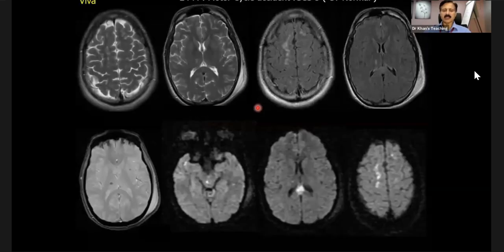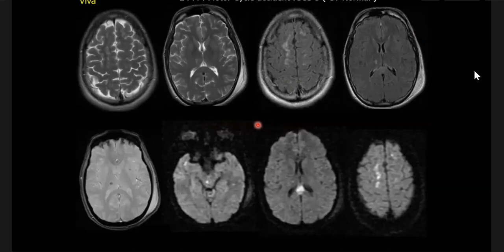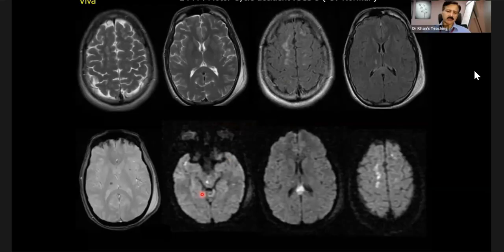So this is a case in which the CT scan was normal. The patient is more or less gone, actually, Glasgow Coma Scale 5. Do you see any diffuse axonal injuries? Yes, actually, at the bottom, I think there is a focus in the midbrain and also in the internal capsule on the right. Right. I have not given you SWI sequences for these levels, but the teaching point here is that this was a diffuse axonal injury, and this is in the thalamus, which is this one.